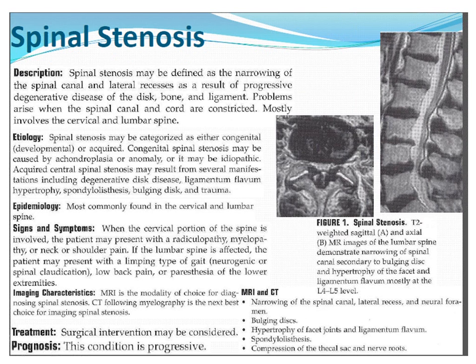Here's another image of spinal stenosis. I talked a little bit about stenosis due to the spondylolisthesis earlier. Stenosis just means generally narrowing of the spinal canal and the lateral recesses. So the spinal canal would be this triangle here, and the lateral recesses are this part of the triangle over to the side. Some people use a measurement overall of how narrow or how wide the canal is. Some people use the measurement, some people just look overall, but any degree of narrowing could be considered stenosis.